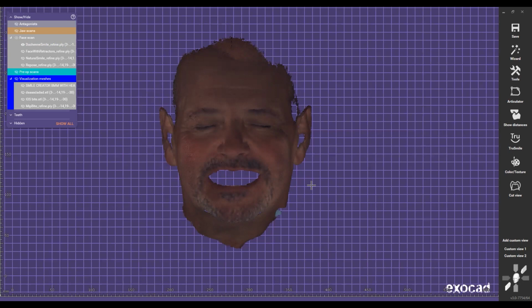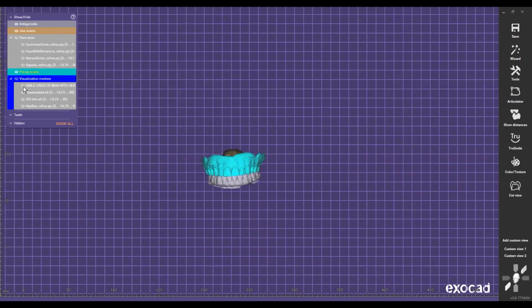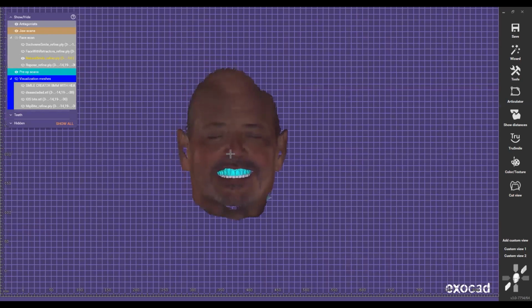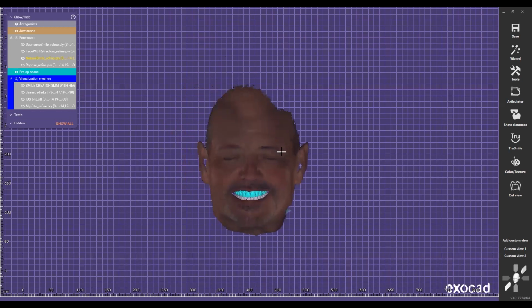So now once we have the scans, here we have everything. We have all the facial scans, we align them. So now it's time for me to start the process, right? We have manuals. I'm the type of designer that likes to create manuals, so that I can teach this, right? And the manuals are basically step-by-step protocols on how to get these cases done the same way for upper, lower, or double arches, okay?